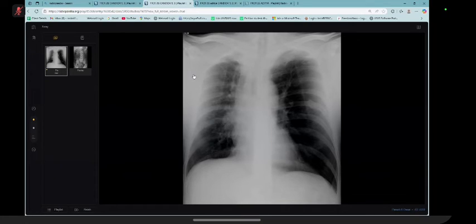Sir, X-ray chest frontal projection of an adult, in which the first and most striking feature is the bilateral upper lobe hyperdense areas. Apart from that, there is asymmetry in the lung volumes, with the left lung being more voluminous. I would like to see if there is evidence of a deep sulcus sign, which I'm not able to appreciate very well because of the exposure factors, but I would like to see if there is any evidence of pneumothorax in this case or not.